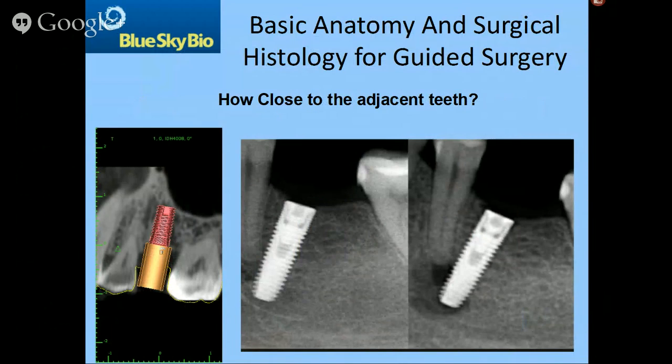So here is a case that was put in. It's touching the PDL of the adjacent tooth. It might have hit a home run on the canal right over here. I don't know. Thankfully, this is not one of my cases. But you can see that a couple of weeks later, this tooth has gone non-vital. So not only is this implant goodbye, but also the tooth is going to need a root canal.